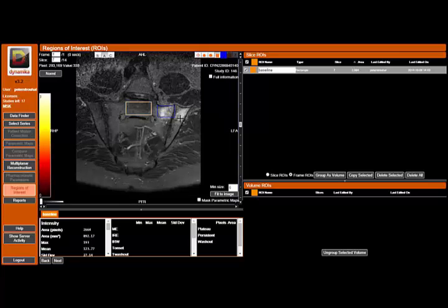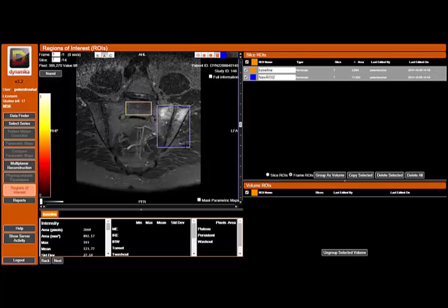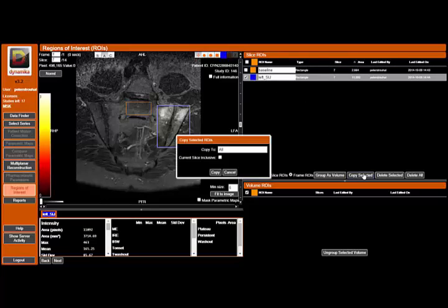Having decided what the baseline is, you can then draw regions of interest around the sacroiliac joints. This can either be starting around what is perceived to be a normal joint or what is perceived to be abnormal signal in the first instance. It doesn't really matter which way you go, so long as all images are appropriately labeled. And perhaps in an ideal setting, you would even follow the same process for all images and for all patients.